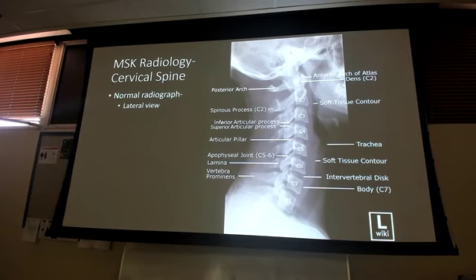Because I can't promise you that this is going to be really clear on all of your x-rays. Now theoretically, if they shoot the x-ray and they haven't gotten all of C7 and that disc space, they're supposed to do it again, because to get a true cervical spine x-ray, you need all of the vertebrae of the cervical spine. But some patients aren't going to be able to do it, and they're just going to do the best they can.